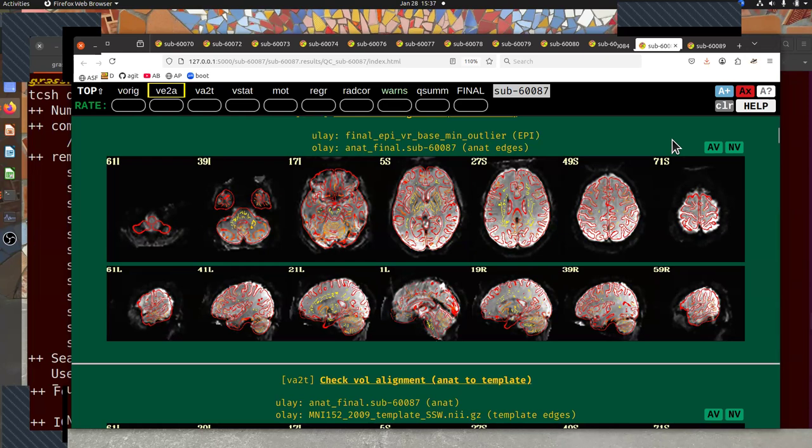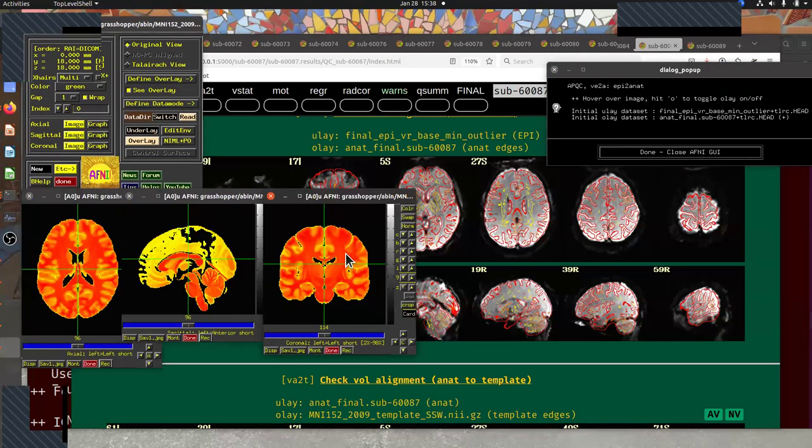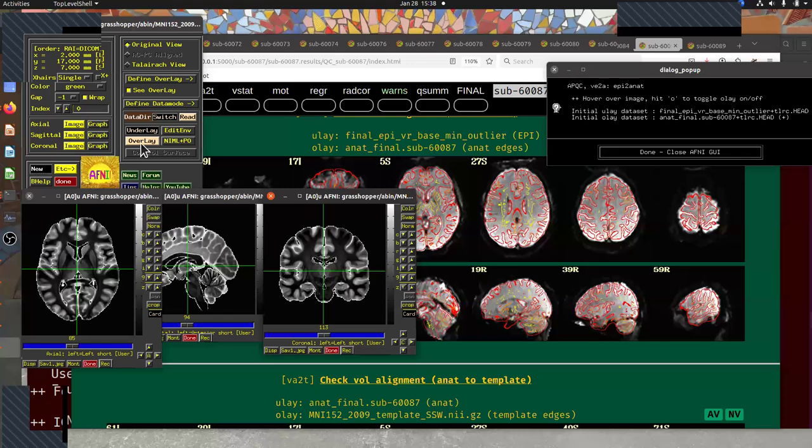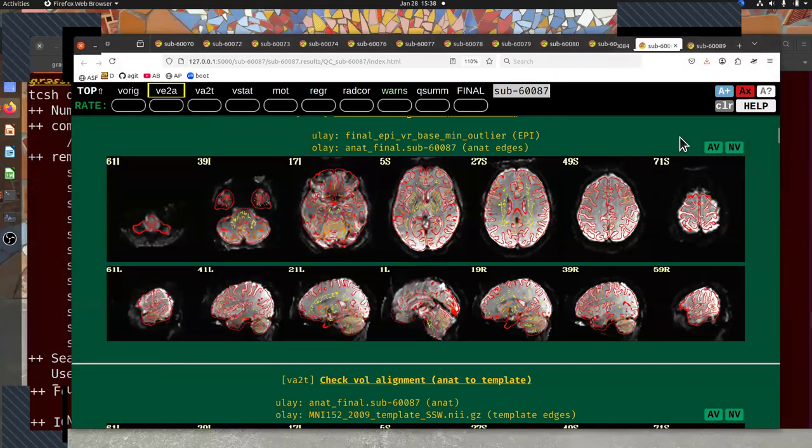Now, in this particular case, in this demo, we've not provided all the data that goes along with these QC directories. So actually, these buttons will not work at the moment. It just won't fire stuff up successfully. What AFNI is doing is loading template data that's not correct because we didn't provide the data, just to keep this directory and download small. Daniel will walk us through later looking at a set of QC HTMLs where you can click the buttons, and they all work when you have the data available for them. Since each results directory might be over a gigabyte, we didn't want to provide 10 more gigabytes to download, basically.